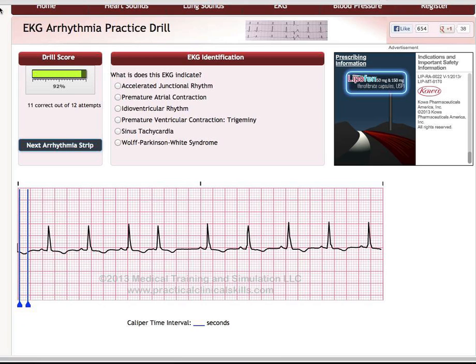We look back at our EKG strip, and we know that this rhythm, does it look regular or irregular? So I would say this is an irregular rhythm. Rate looks to be normal, around 75. Remember 300, 150, 100. I guess 100, my bad. It's a little early in the morning. We can check it down here, 300, 150, 100. So it is a little fast, right on the border of tachycardia, so around 100 or so. That's not a big deal. That's not our main concern.